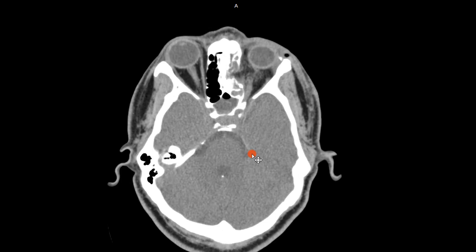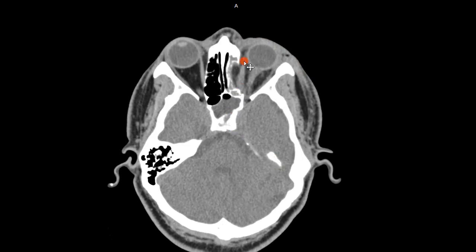Here we can see fracture of the lamina papyracea, while diffuse haziness is noted in the retrobulbar fat surrounding the optic nerve and extraocular muscles. We can compare this with the contralateral side: medial rectus, optic nerve, lateral rectus and eyeball. Fat planes are neat and clean on this side, while the preseptal soft tissue is sharp and normal. And here we can see diffuse inflammatory changes in the left preseptal region and over the left temporalis muscle. Medial rectus is diffusely swollen as well.